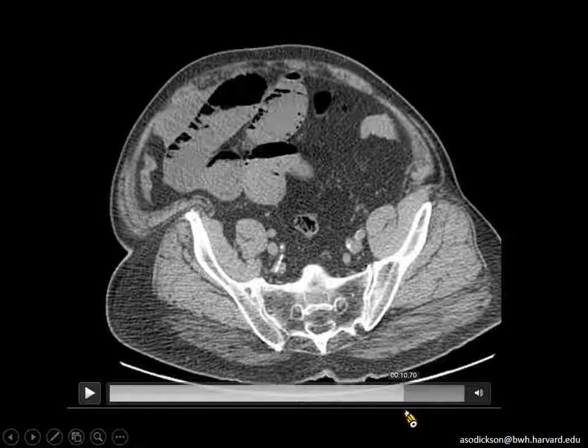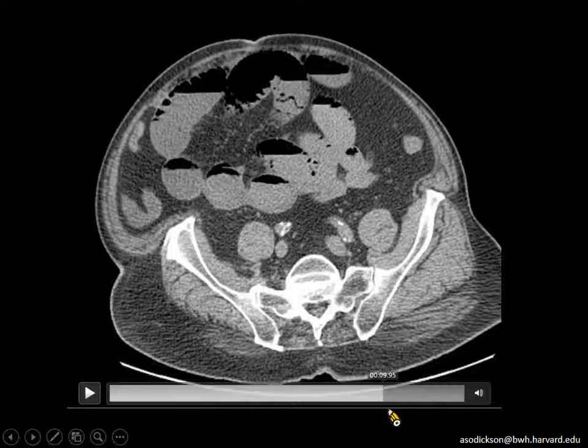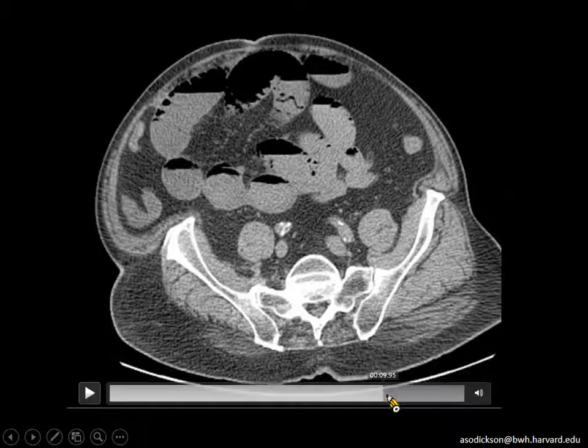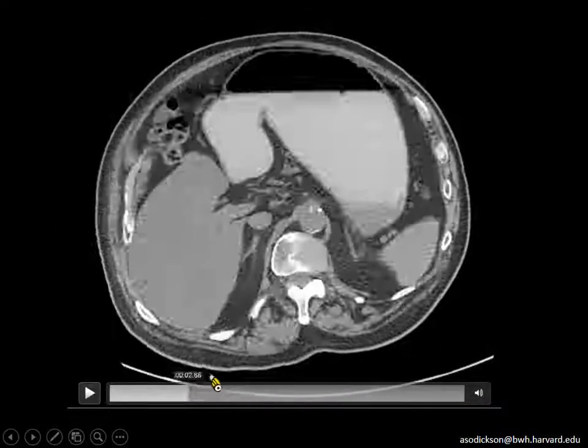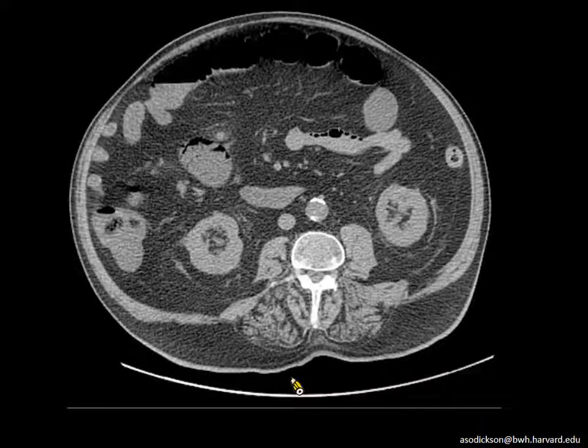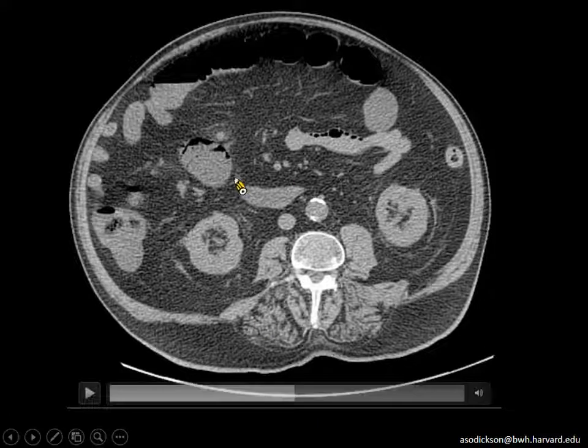And this can be a very challenging diagnosis on CT, particularly on a non-contrast CT like this, where we cannot assess the vasculature. But one of the ways that the small bowel commonly reacts to primary ischemia from a vascular cause is it gets atonic, distended, with a very thin wall. It simply does not peristalse as normal. One thing to keep in mind when you see something like this is that this might represent bowel ischemia rather than bowel obstruction. Obviously, these have very different management implications and implications for the patient, so it can be helpful to keep this in mind.